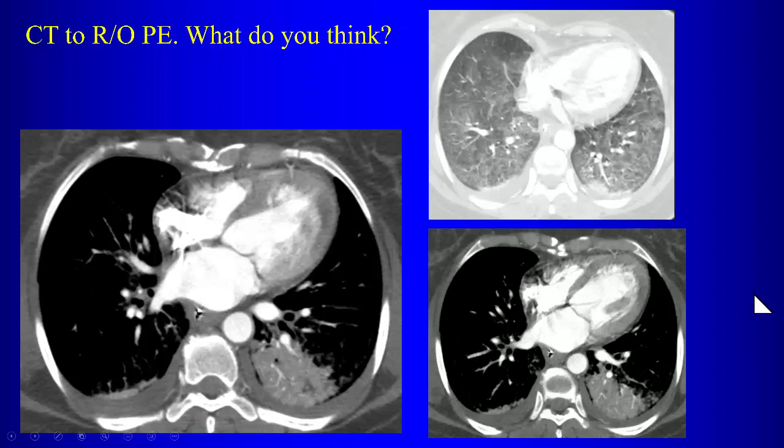You think it's pulmonary hemorrhage? No. No, okay. So what do you think is causing it? So if you're thinking pulmonary edema, what else are you going to look at on the CT? You're going to look at the heart. What do you notice about the heart?